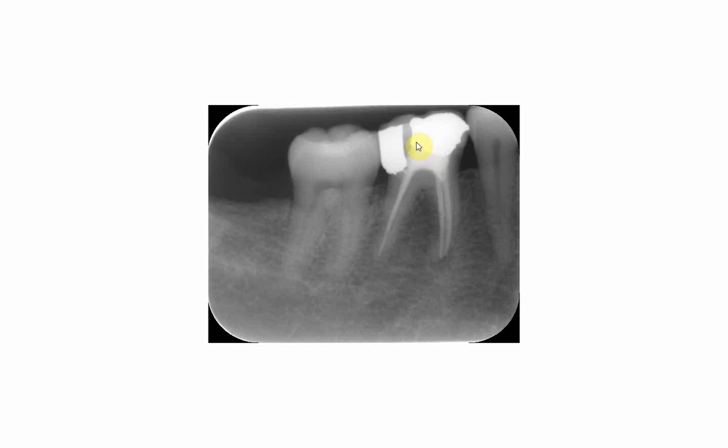So in some cases, dentists leave some of the zinc oxide temporary material, which hardens, and it is used as a liner for the amalgam filling. The rest of the filling is gutta percha, and you can see the radio opacity of gutta percha compared to the zinc oxide eugenol liner, and compare it to the radio opacity of the amalgam on the other side.